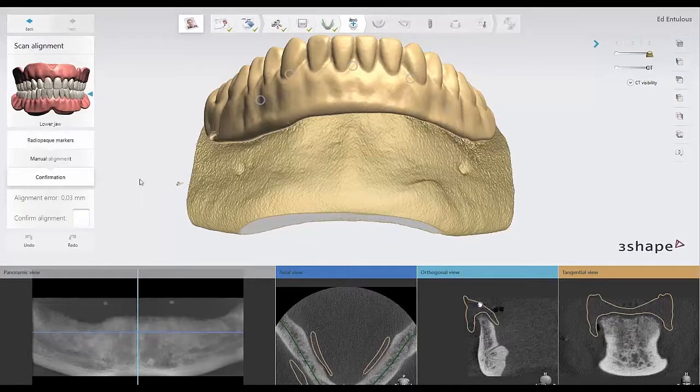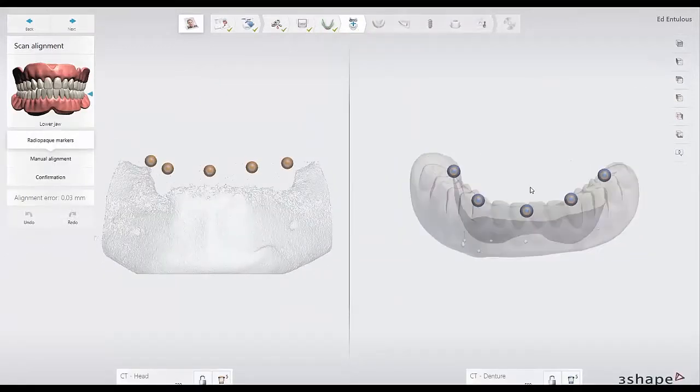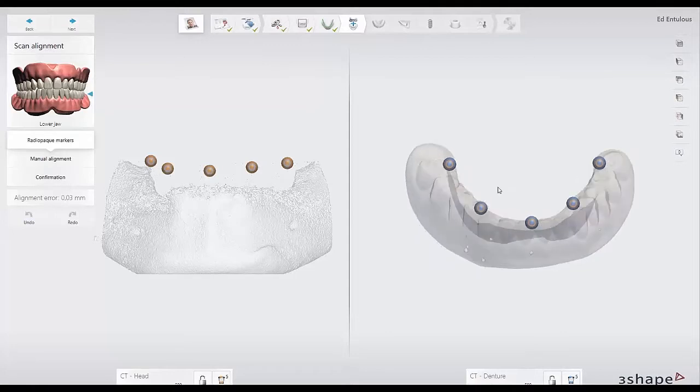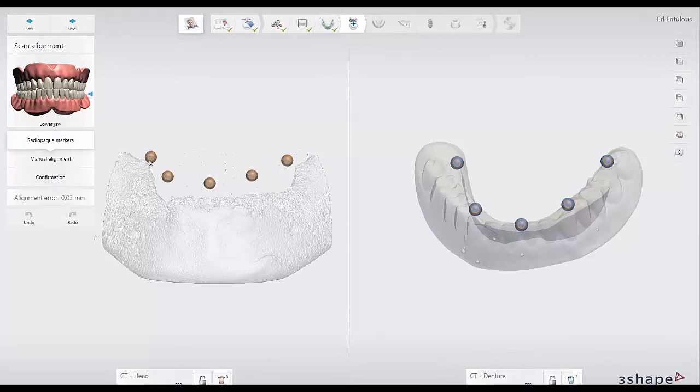Yeah, so as Birk mentioned here, the cool thing about this workflow step is really that what we see on screen here is what the software gives us automatically. So this is an automatic step where it goes in and actually looks for these markers and defines them, the ones that it can find without any input from me or from the operator of the system.